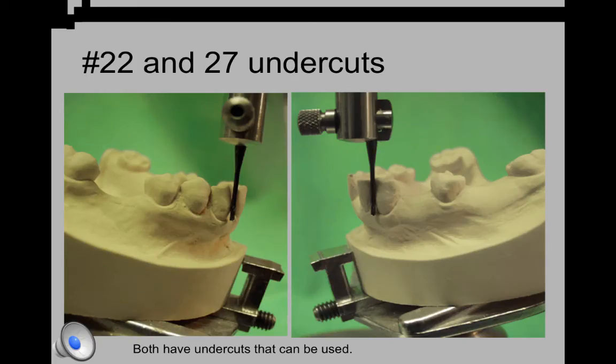Our next options would be for number 22 and 27 to have mesiobuccal retention with a cast circumferential clasp coming from the distal into the mesiofacial undercut. Both of these are acceptable solutions, but from an aesthetic standpoint, it's not very aesthetic. So I would probably choose to put them on the two premolars posteriorly to get a little bit better aesthetics, and those would probably be effective enough to prevent rotation around that anterior fulcrum.